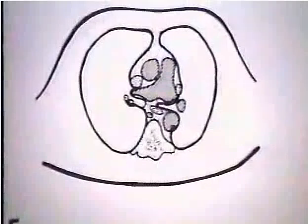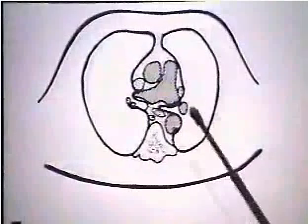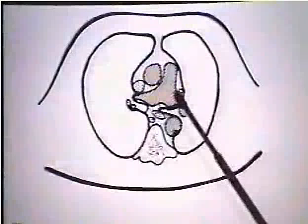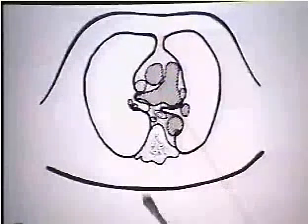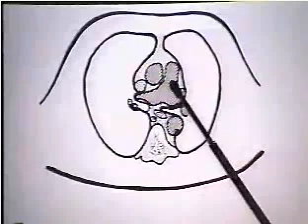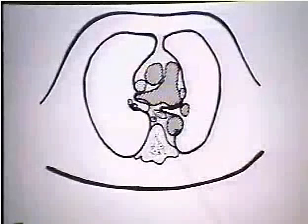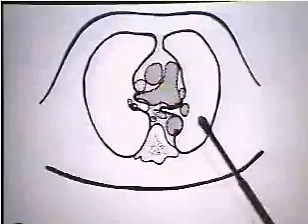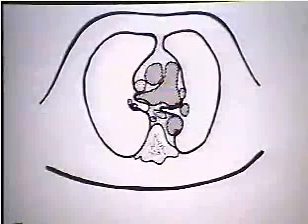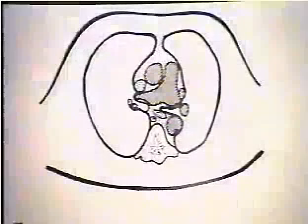If we go down a little bit further, the left pulmonary artery becomes interrupted because we are now at the level of the left bronchus, which it must go over. Therefore, there is no more left pulmonary artery by the time we get down to the level of the bronchus. We now are at the level of the right pulmonary artery, which is a lower structure than the one on the left. The descending portion of the left pulmonary artery may be seen over here, posterior to the bronchial shadow.